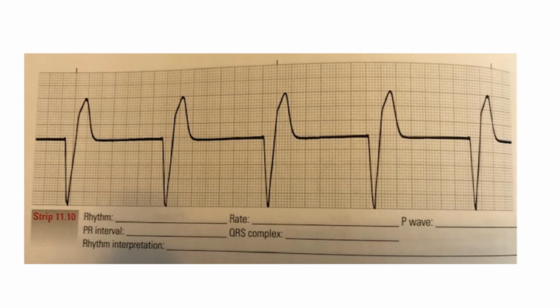So it's ventricular. So what type of rhythm in the ventricles? So it is idioventricular because it's very slow. The heart rate is 40, and you know that the idioventricular rhythms are usually 40 or less. So this is an idioventricular rhythm.